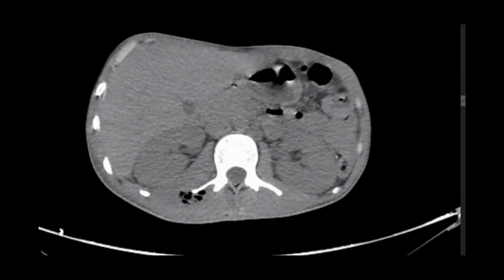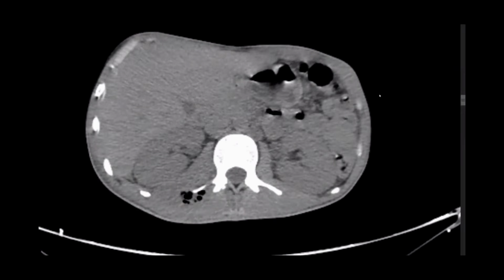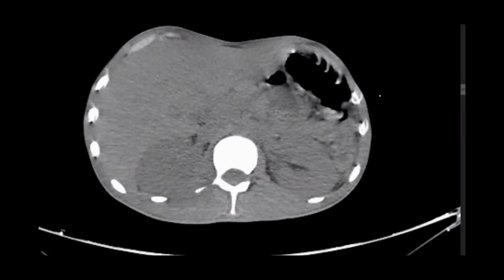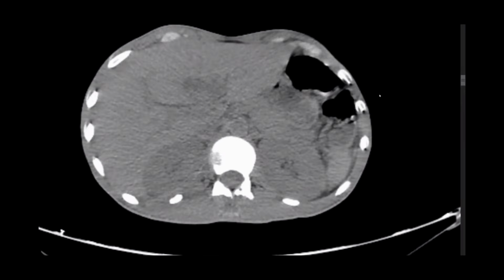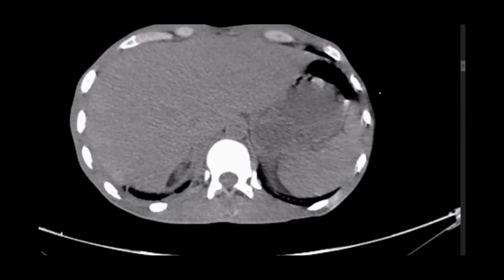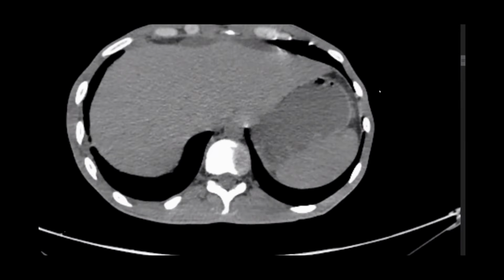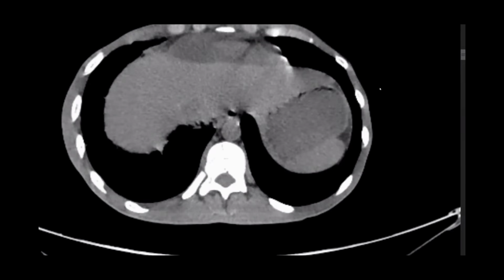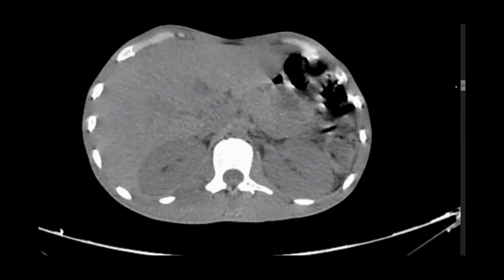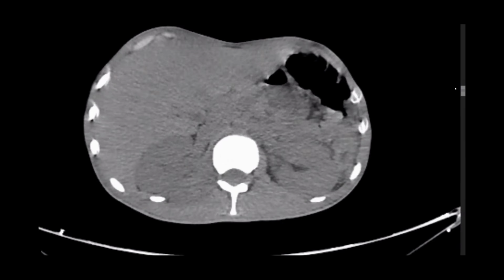And we did an ultrasound for him. Can you please scroll? I've been presented with axial CT abdomen images, CT KUB images, a non-contrast study of a patient who presented with severe right iliac fossa pain. I would like to scroll the images from the top to the bottom before describing the findings further. So I would just scroll simultaneously, noting any significant abnormality.